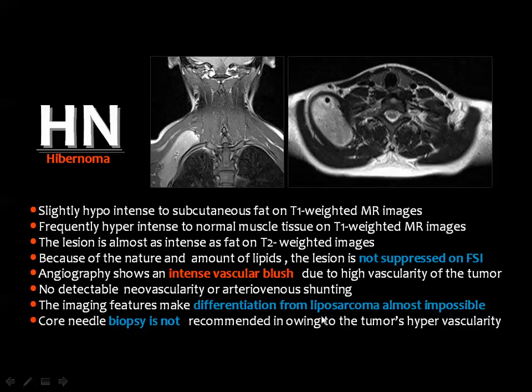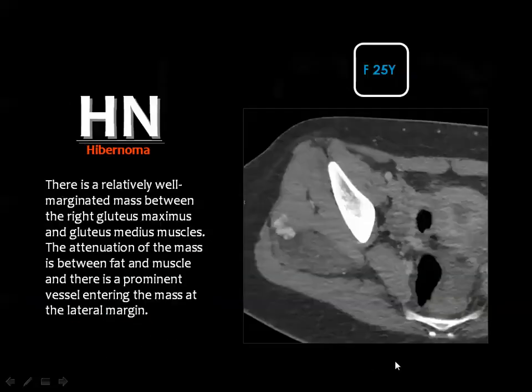And the differentiation from liposarcoma may be impossible. Many times, if you are going to take a biopsy from this lesion, be careful, because this lesion is hypervascular. And this is a hibernoma. You see the fatty lesion.